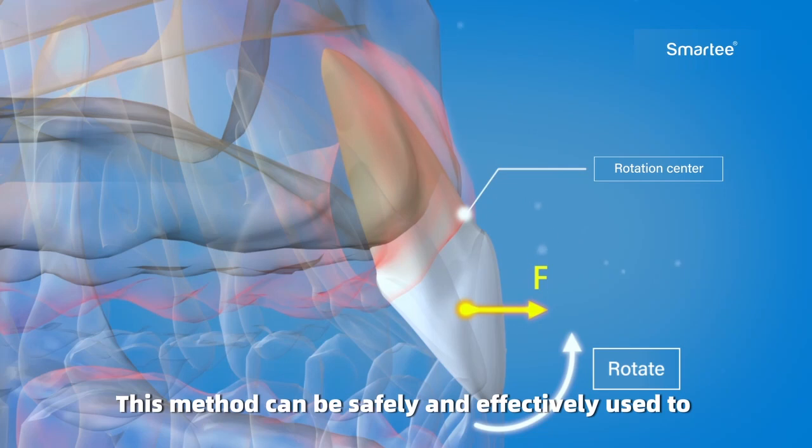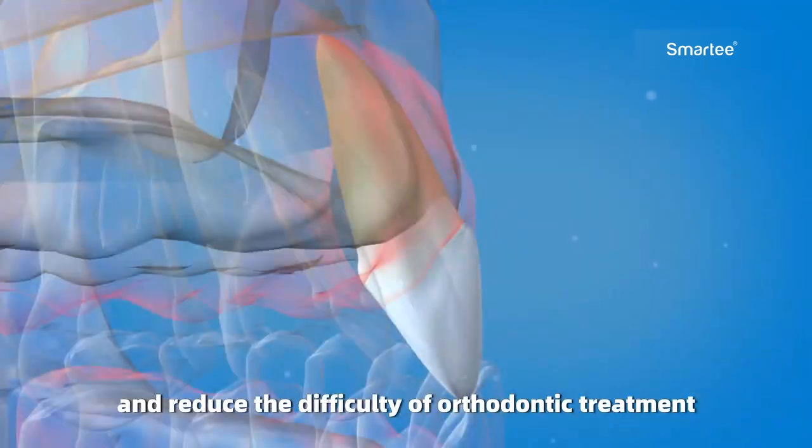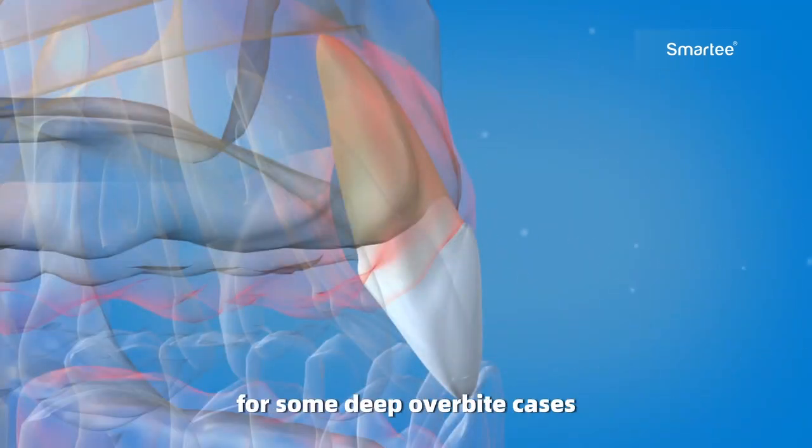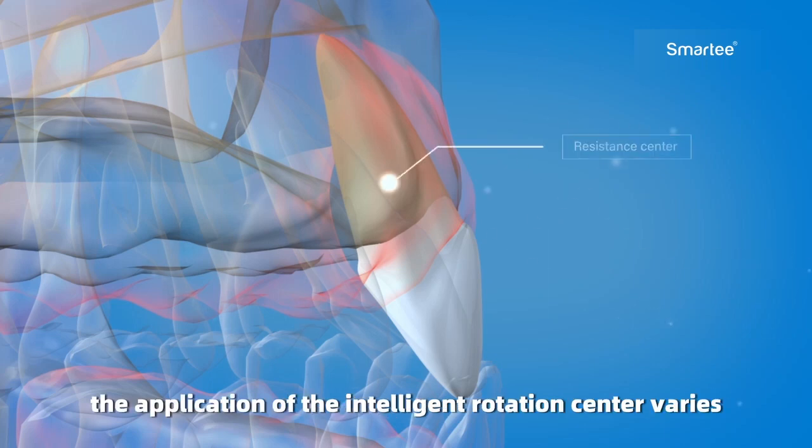This method can be safely and effectively used to apply torque control and anterior tooth intrusion, and reduce the difficulty of orthodontic treatment for some deep overbite cases. In different cases, the application of the intelligent rotation center varies.